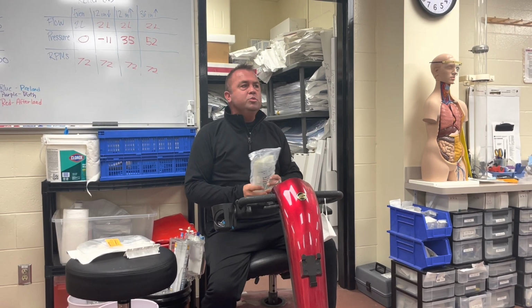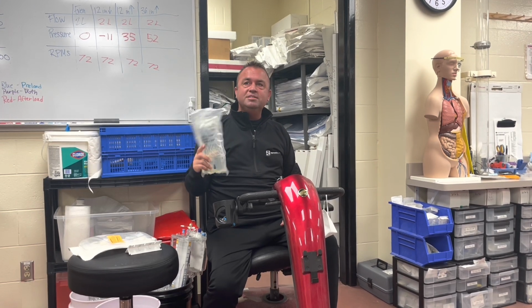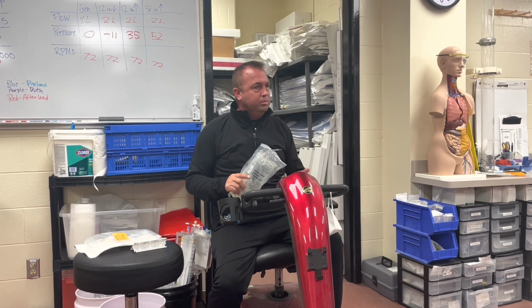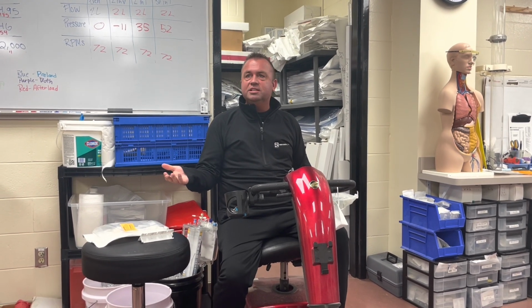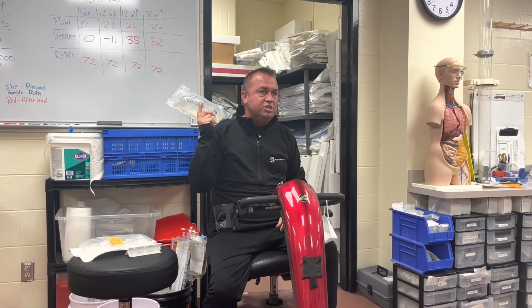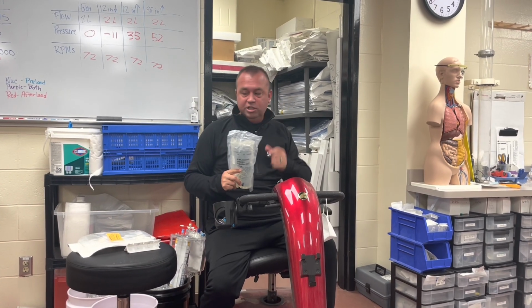That makes sense? So we limit heparin exposures, but the most common form is still heparinized saline. Saline is making a big run. What we aren't going to use are Plasma-Lyte, Normosol, things like that, because those have all the electrolytes and things added, so we don't need that. Saline is super cheap, 99 cents a bag or whatever it is, and super easy to use.